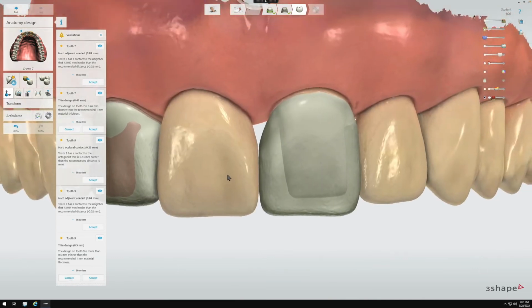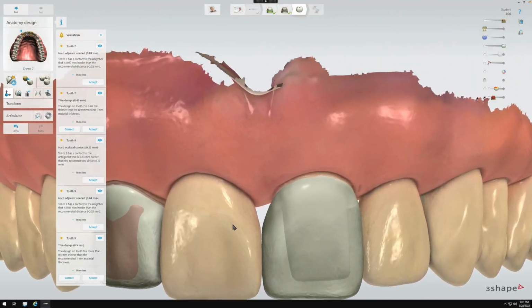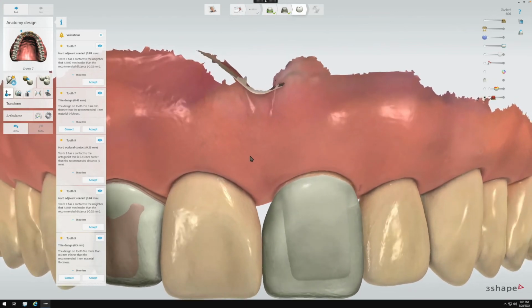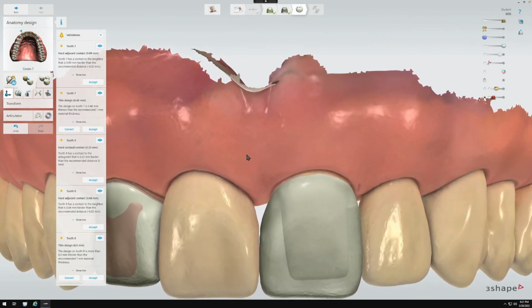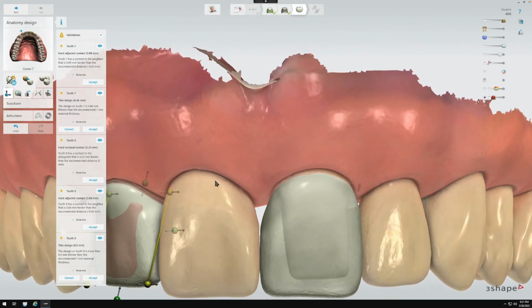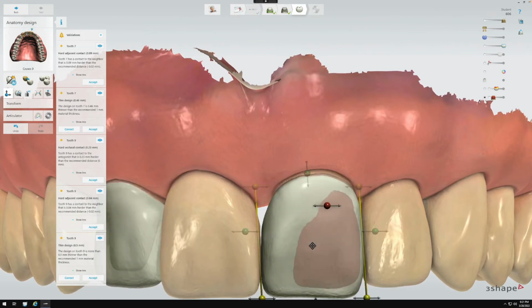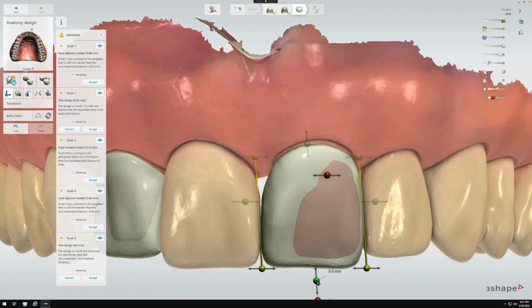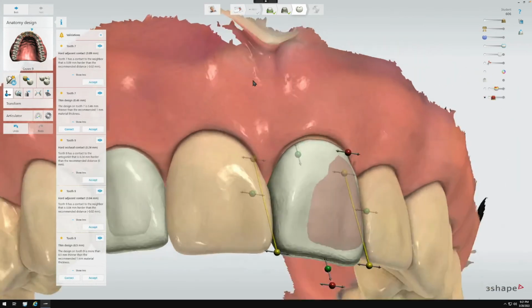Sometimes I'll pull the teeth and line it up with the edge of the screen to see if things are symmetrical. Don't have to get this perfect, but it's something I like to do. So this could come down maybe a tiny bit more. I think the height of this guy is pretty spot on. So pull this down a little bit. There we go. So that's looking pretty good. I think we're just about there.